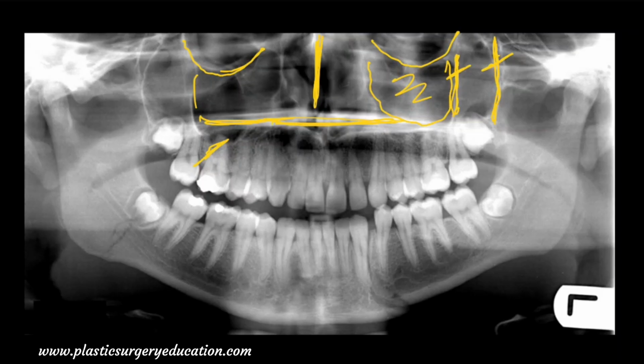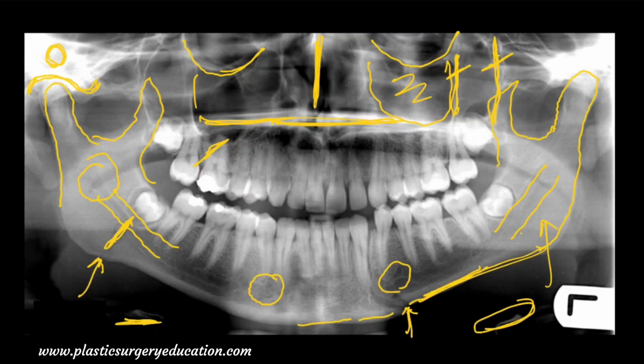So while identifying, I think these are the important structures from our point as plastic surgeons, which we encounter in clinical practice and also which are discussed in Viva. From here on the Viva, you can take the Viva for the clinical aspects and the questions in a different video.